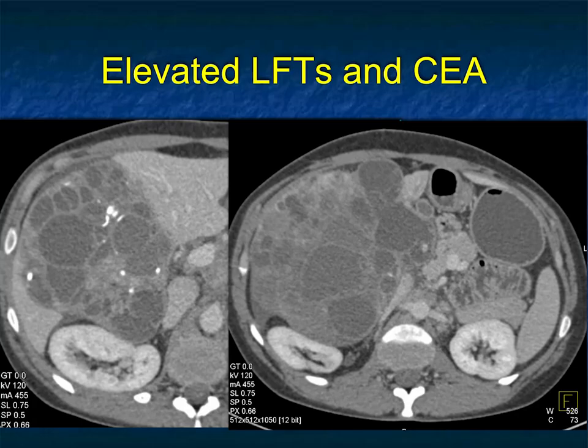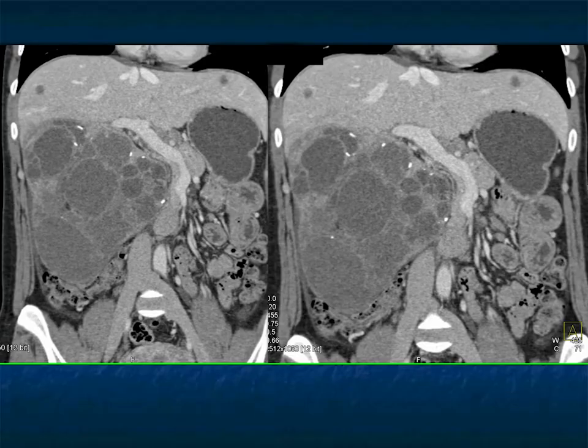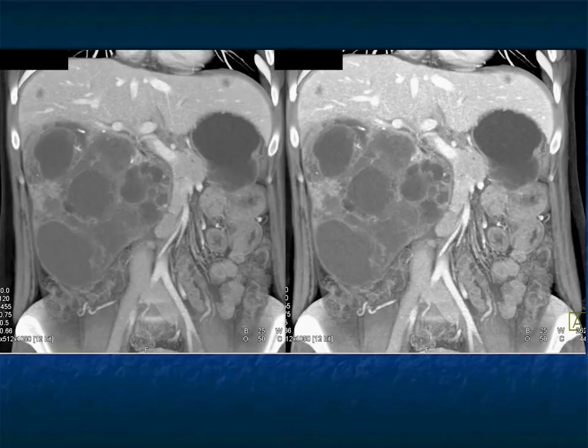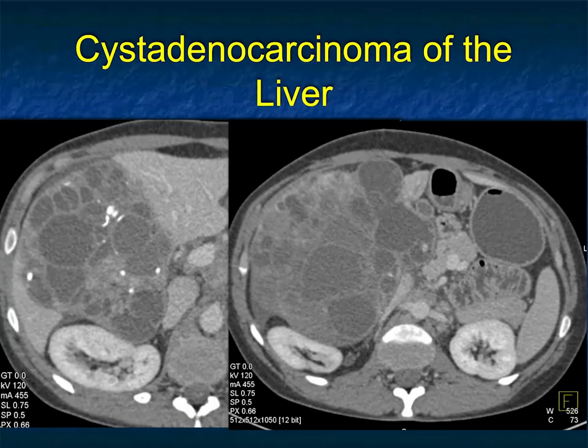You could talk about complex cystic lesions like this, multiple cysts, dystrophic calcifications. That appearance to me is malignancy. I could think about hepatoma. I could think about a sarcoma of the liver. Those are possibilities. I could think about a biliary cystadenoma. There's compression of the portal vein, but no invasion of the portal vein. Multiple images showing very sharp margins to the lesion. It is right lobe, not left lobe, but still a biliary cystadenoma would be a good thought, though there are multiple cysts present, and this was a cyst adenocarcinoma. So you got the right answer.